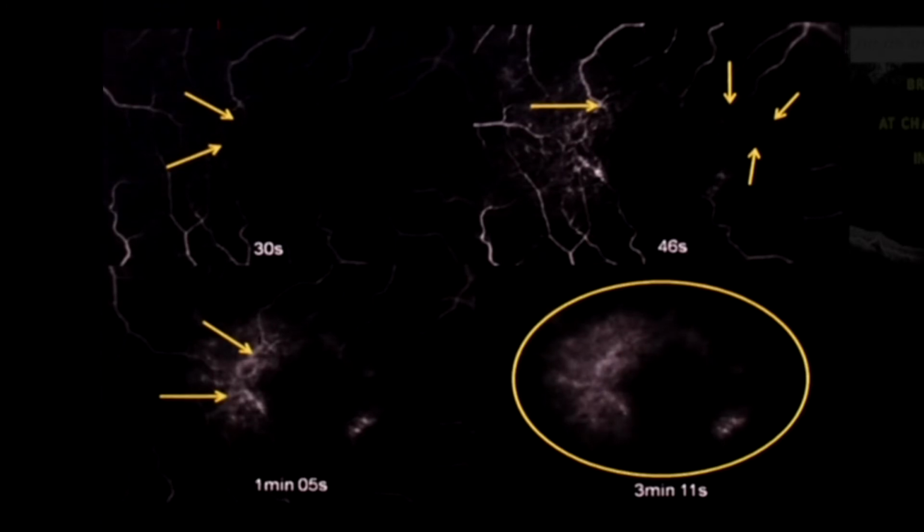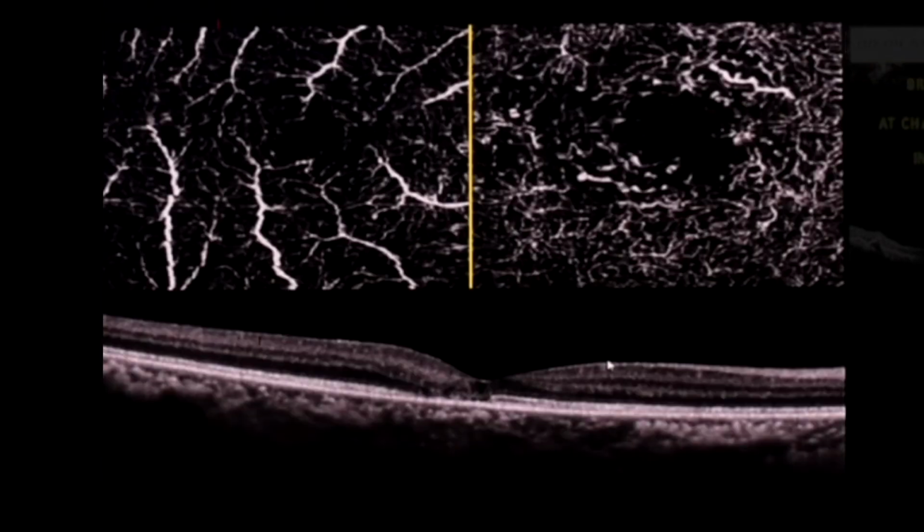You can also see an area of hyperfluorescence which is a little bit more intense than the rest. It is probably due to the aneurysm, and the telangiectasias within the hyperfluorescence are better appreciated. You just have to see these lines which are a little bit more hyperfluorescent than the rest. On OCT angio, one would be able to see the separation between the vessels, which is more distinct in stage 3 compared to the rest. And most of these changes happen in the deep capillary plexus.